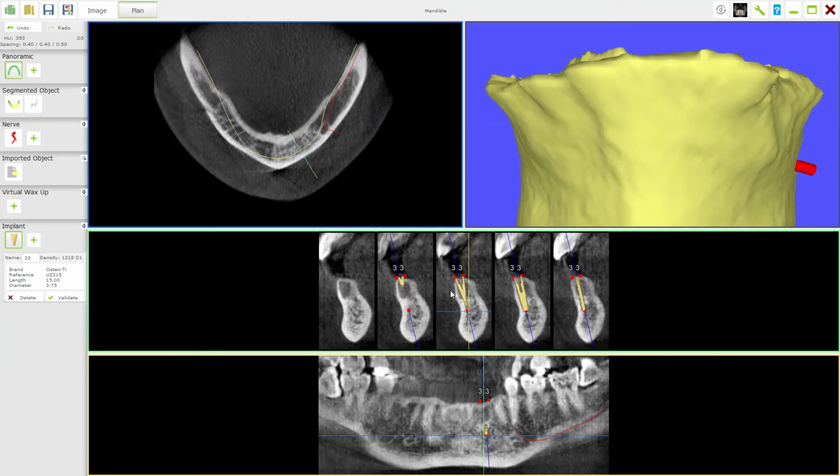And when you get several dentists design things, obviously people are going to pick different implants, different lengths of implants. That's entirely up to you. I like to have 2 millimeter bone zone all the way around my implants if I can. I like to have the maximum length. I'm more interested in length than actually diameter of the implant. The diameter of the implant is probably only important in the first few millimeters.